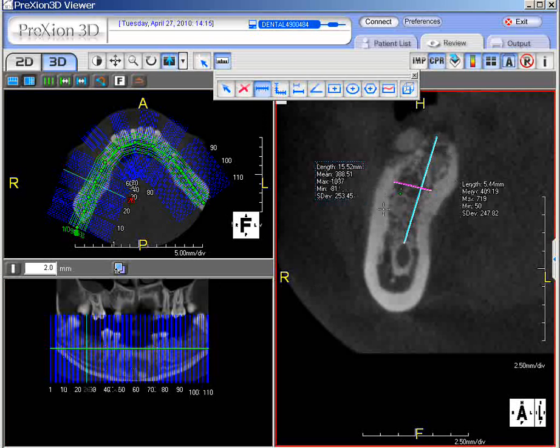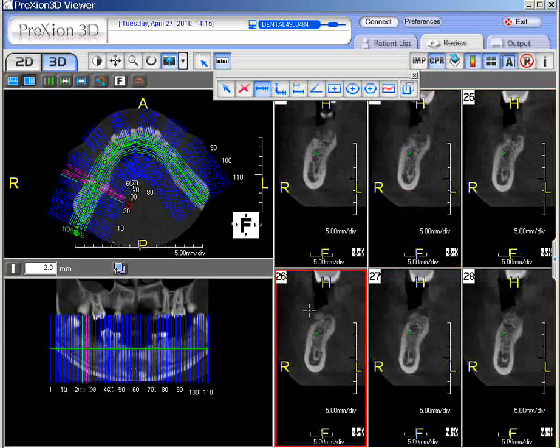To go back to the other screens again, to get back to the matrix, double click it, you go back to the screens. Remember, we could save that as a scene as well. I will demonstrate that too.